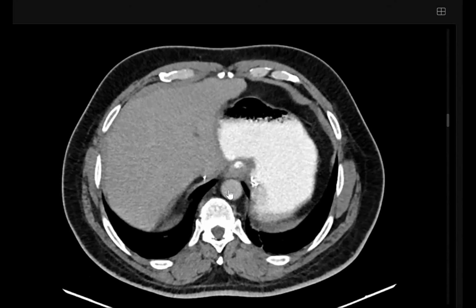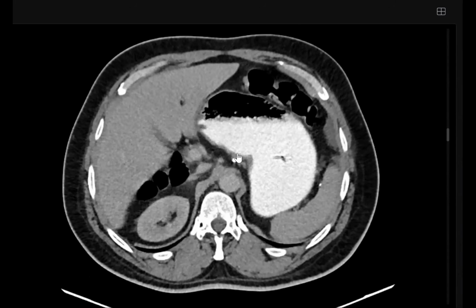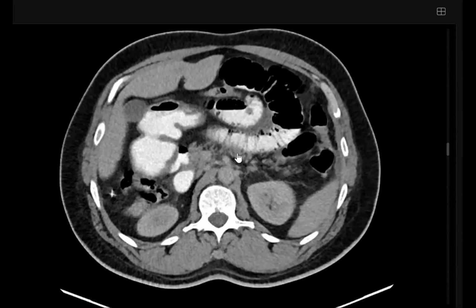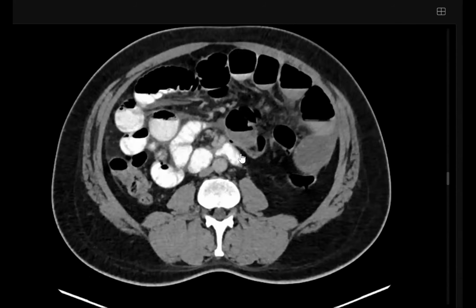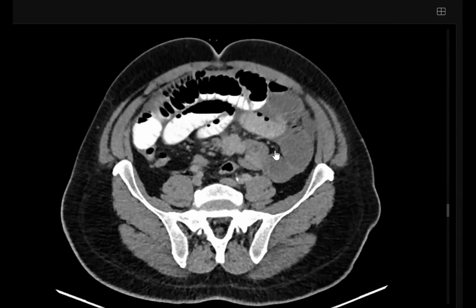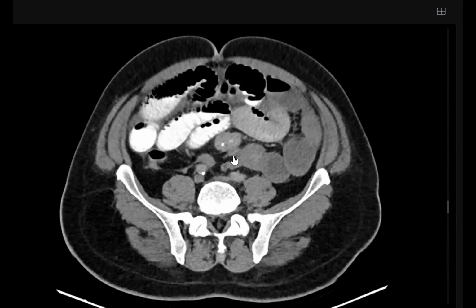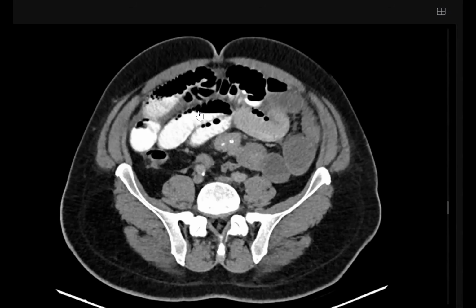In my routine practice, I want to check for this in the arterial phase because carcinoid usually sends arterial enhancing metastasis. Also, no masses within the bowel because mesenteric carcinoid usually is secondary to ileal carcinoid. Very good, my friend. Very good.